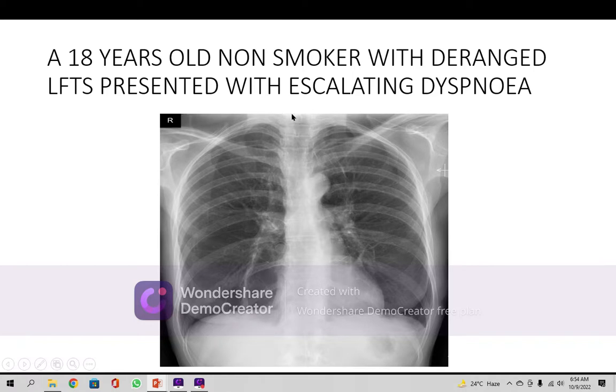I explained that in this X-ray the trachea and aortic knuckle are prominent, and the perihilar shadows are very markedly visible. Lower down is the lower branch, the upper branch of the hilum. But to me, in all the lung fields the bronchovascular markings are very narrow.